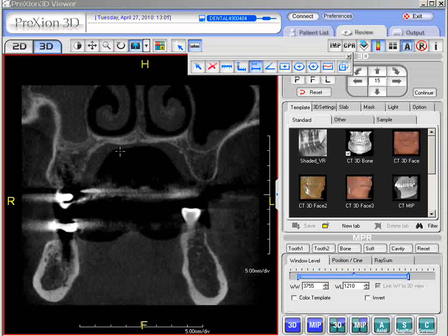So, for instance, here we just take this portion of the maxilla, and here we have the right side versus the left. So let's say we want to just measure the length of the right versus left. So here we'll start, go down to the ridge of the bone, and here's baseline 1. It's always going to be the first measurement, always baseline 1. Now if we go to the second measurement, we're just going to left click it, drag it down, and release it to the edge. So what we're saying is the left side is 83% of what the right side is. So that's basically how you use that feature if you prefer to use it at all.